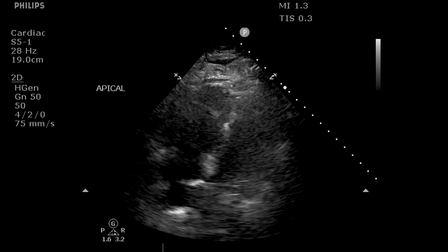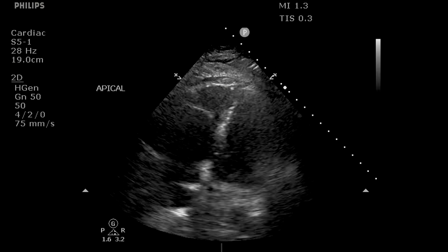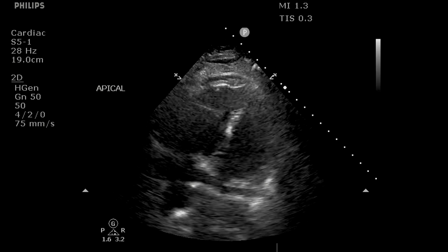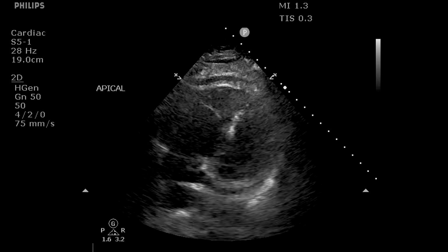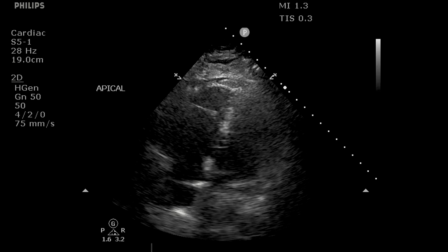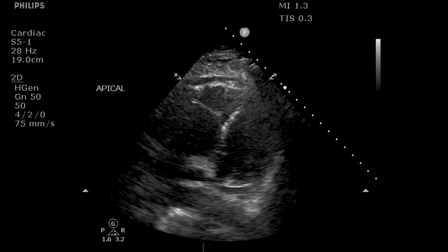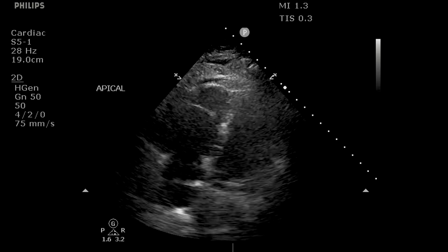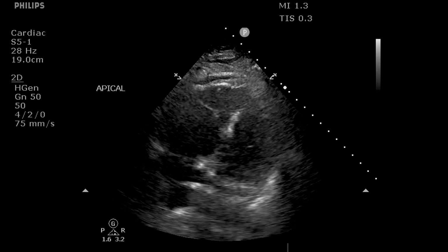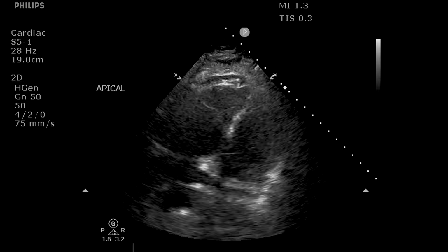So one thing that you have to be careful of is when you see the super tachycardic patient that you really scrutinize these steps that we talked about. Do I see the border? Is the wall excursion appropriate? Is the wall thickening appropriate? And then if you are struggling with that, take a clip, right? Slow that clip down, whether you turn the cine loop speed on your playback down, or you just slowly scroll through the cine. And what is that chamber doing as you take the speed component away and look at it, compared to the other one.